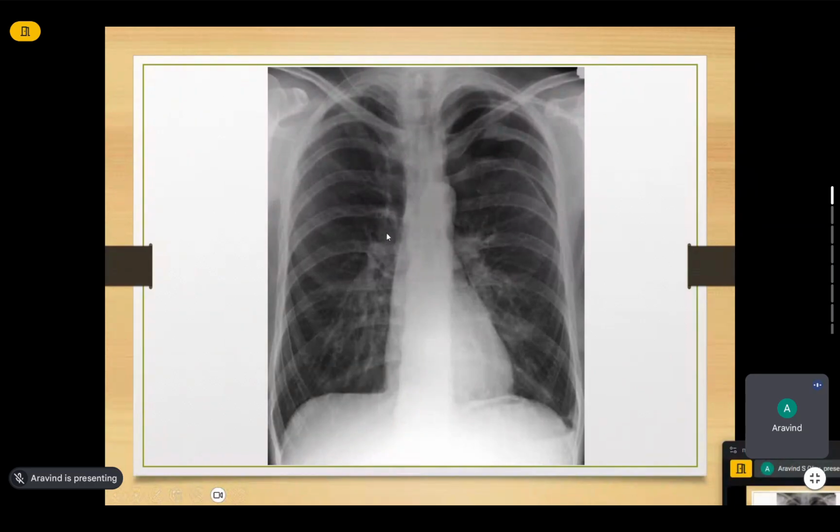So this being said, you just look at this X-ray. You just compare the lung fields, and in a particular zone you can see that there is absence of lung field marking. Could you tell in which part? Just keenly observe this X-ray. As I said before, the lung field contains branching things called vasculatures. And when you keenly observe, you can see that in a particular part, there are no lung field markings. Could anyone guess?